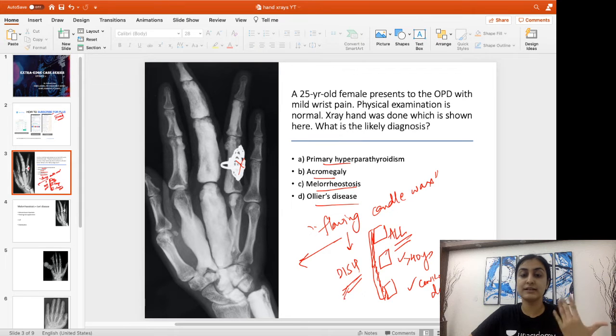And remember, this is a differential for ankylosing spondylitis, and this is the fact which was tested in the AIIMS exam. So remember, ankylosing spondylitis will have reduced intervertebral disc space, first differential. Second difference being that it's not just the anterior part which is involved in ankylosing spondylitis. There is a pan joint fusion of the spine, leading to a very rigid spine. Thirdly, the demographic, very different. It tends to affect younger boys.